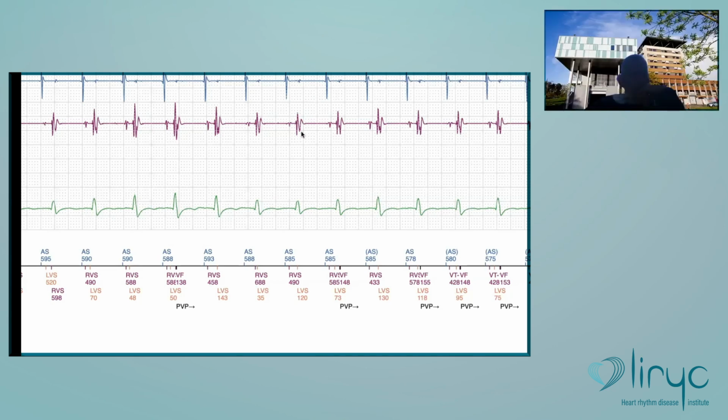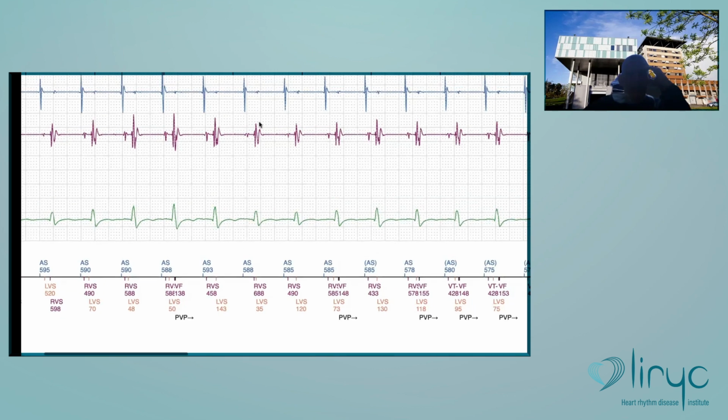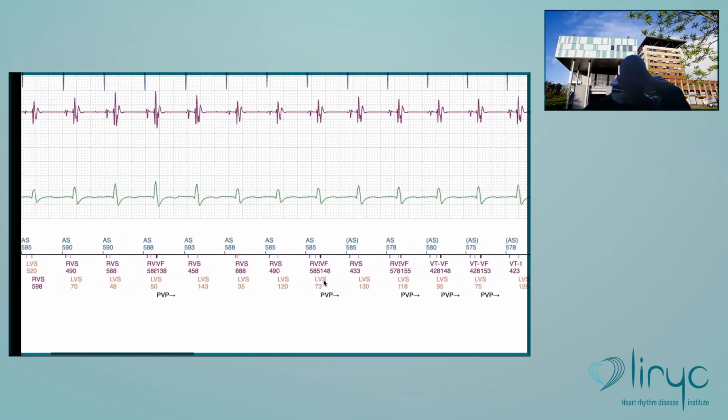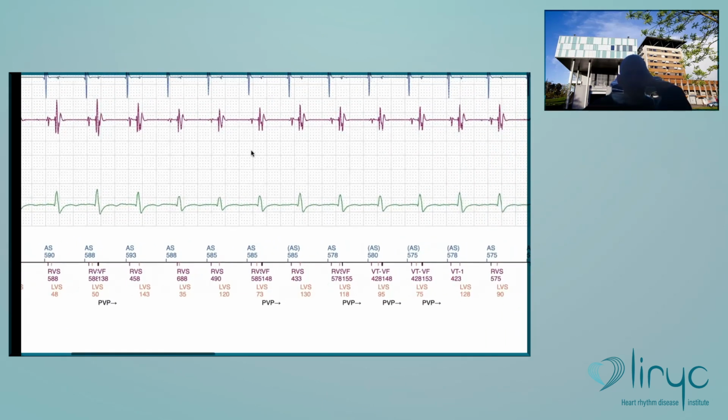So, yes, I agree. So the actual signals, it's a sinus rhythm here. It's probably, you see, atrium to ventricle, one-on-one conduction. And if you look at the counters and the markers, you see here this signal is oversensed, one signal, and then the next one is for sure short.